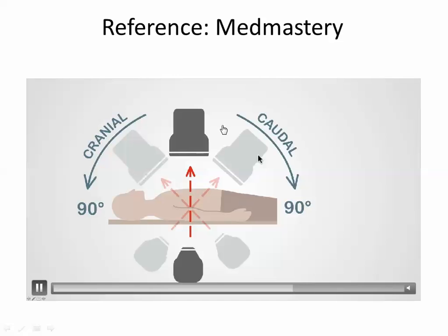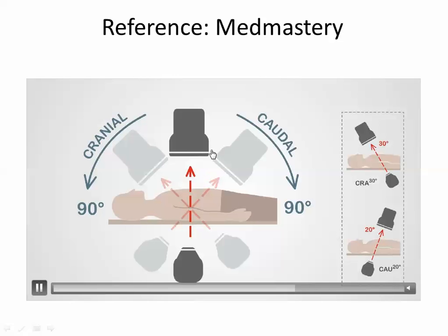So this is the II, or image intensifier. It is the camera, and this is the X-ray tube. We just look for the one above, which is the II. Okay.